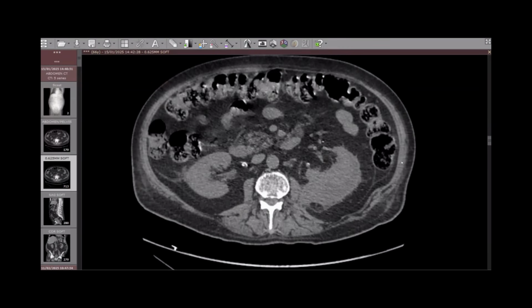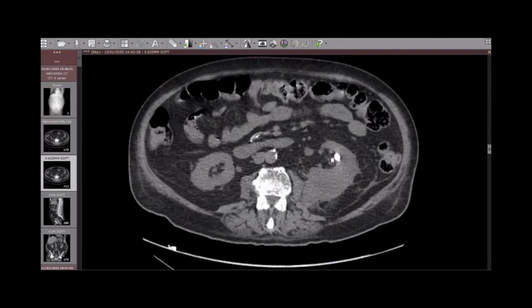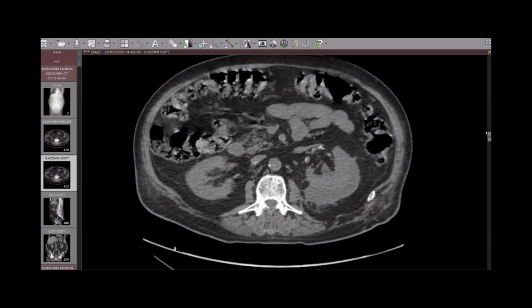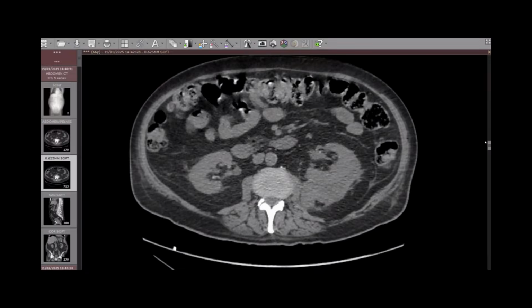All of these are many possibilities. Also hematogenous spread, you are right. Maybe also post-traumatic hematoma or infected hematoma converted to a perinephric abscess. Those are many causes for these perinephric collections.